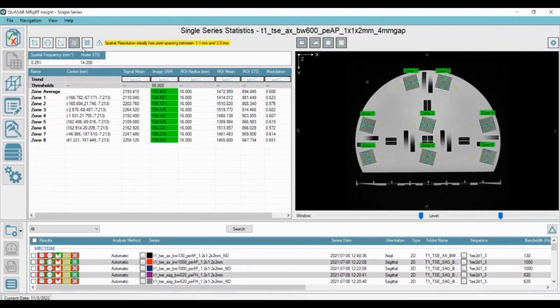The following page I have is dedicated to spatial resolution. Within the phantom, we have these line pair imaging zones where the spatial resolution is calculated as the modulation transfer function in each of these zones. There are 8 in total scattered around the phantom, so that you'll be able to understand the spatial resolution throughout the entire 40 centimeter volume rather than just at a specific zone.